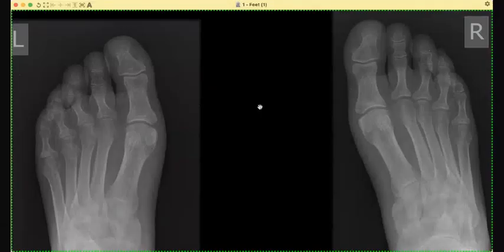Okay, what is your differential diagnosis? What else? You've said gout. Other differential diagnosis? Anything else? Okay. Maybe psoriasis, but in psoriasis there is more intra-articular affection, pencil-in-cup deformity, and more deformation of the joint. Psoriasis. Psoriasis involves the feet. Okay, another question from my side. Does it involve the feet usually?